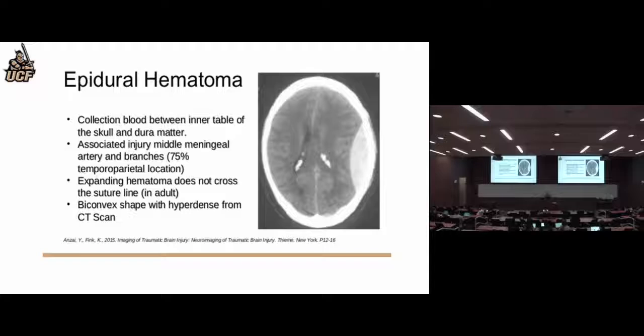Another thing I should mention to tell the difference between the epidural and the subdural: you may not be able to see these that well on the scan, but you'll recall from your study of the skull that the skull is not just one continuous bone; there are sutures between different sub-bones of the skull. And the dura, at least in adults, is connected pretty tightly to the skull at certain points. So if you're above the dura, when the dura comes down like that, the blood is trapped between the suture connections. That's another reason why it bulges out like that. So this is probably a suture connection here, and this is one here, and this is your blood.